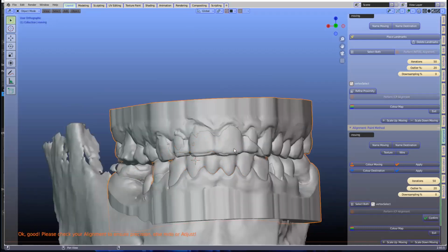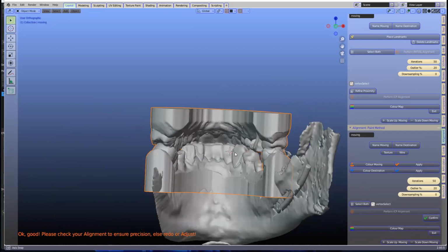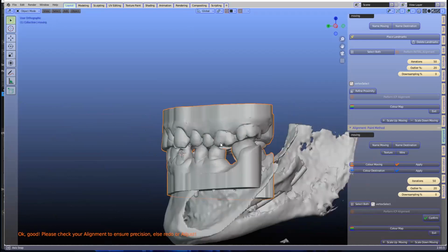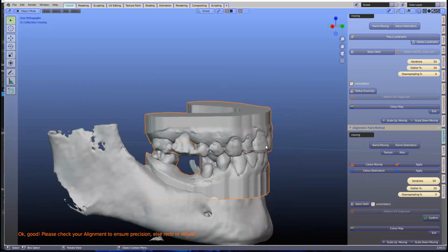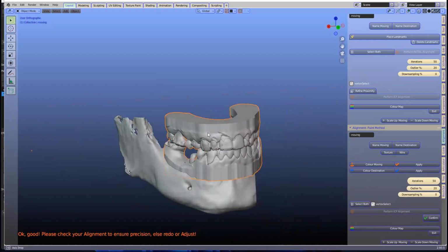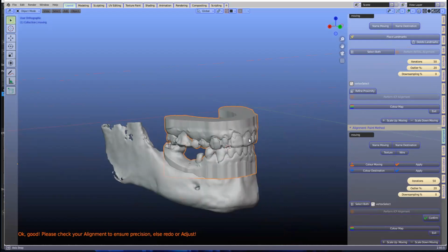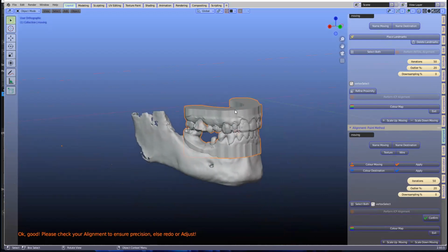Okay, and confirm. Yeah, that's looking way better, but we will confirm that in the actual. Can you see here? This is probably from my segmentation model not having the threshold enough. So that's another thing. Now, what we're going to do is we're going to put this into 3D Slicer.